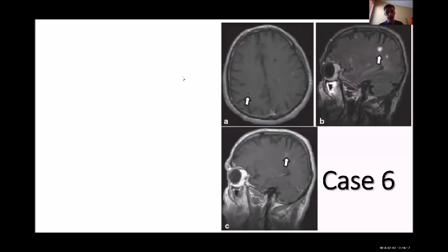What else? Any other suggestion? Just describe what you see. There's T1 and T2 MRI. What do you guys see? I see a well-defined round shape. Okay, so it's well-defined and it's inside the brain. What will it be? Looks like maybe an infarction, but an infarction would not be well circumscribed, so it can be an abscess or calcifications.